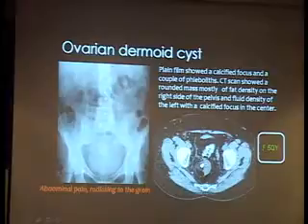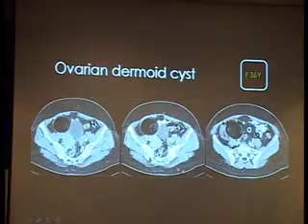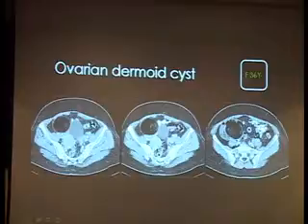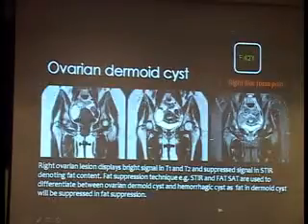But if you have the CT scanning, you may see the 3 components of the dermoid cyst: fat, calcium, and fluid or somewhat solid component. Then, if you see here, you can see a cystic lesion which is predominantly made of fat, and this is different from the fluid. The fat is more dark at the CT images, and inside the dermoid you should see other soft tissue material which represented the other types of tissue inside the lesion.